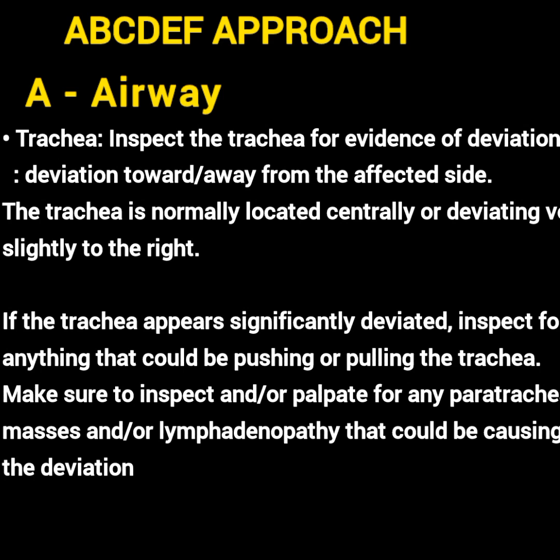If the trachea appears significantly deviated, inspect for anything that could be pushing or pulling the trachea. And also make sure to inspect and or palpate for any paratracheal masses or lymphadenopathies that could be causing the deviation.